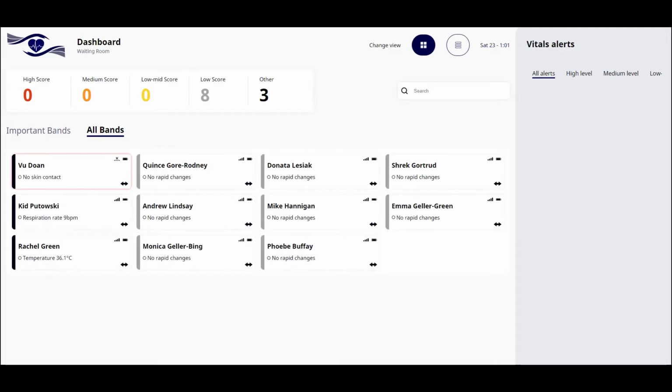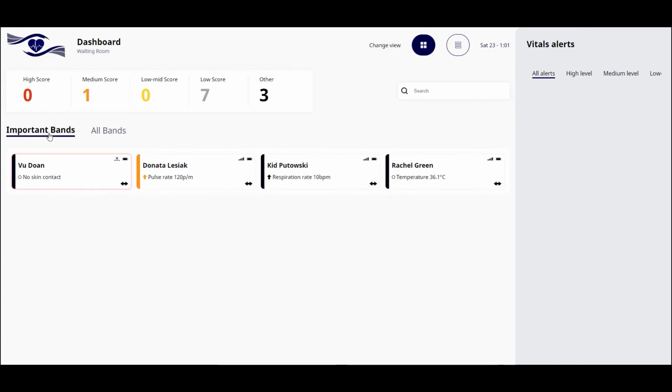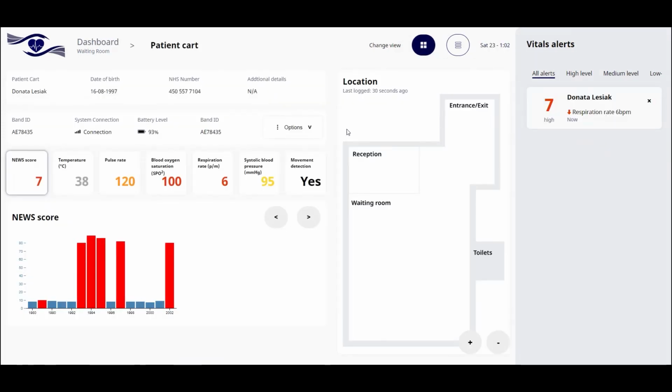This part of the video shows the interface visible by the nurse, which looks similar to the admin interface, but with more features available. For example, the nurse can see all details about new scores and vital changes of the patients in organized views. In these scenarios, the nurse can oversee any changes that are happening to the patients and view the individual patient data in detail, like checking data trends, and manage the patient using available options like moving the patient to different department views.